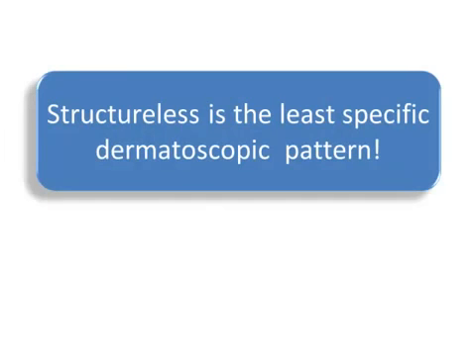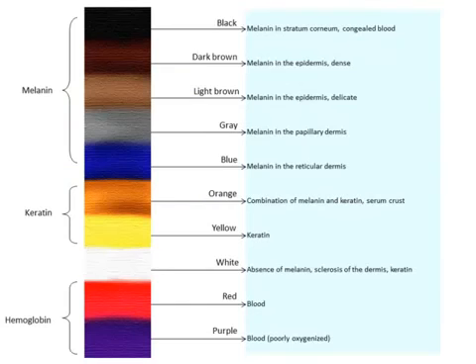As a general rule, in comparison to other patterns, structureless is the least specific dermatoscopic pattern. We have no structure, and we cannot use structure to make differential diagnosis. So we are left with color, correct. We have to use color to make meaningful differential diagnosis.